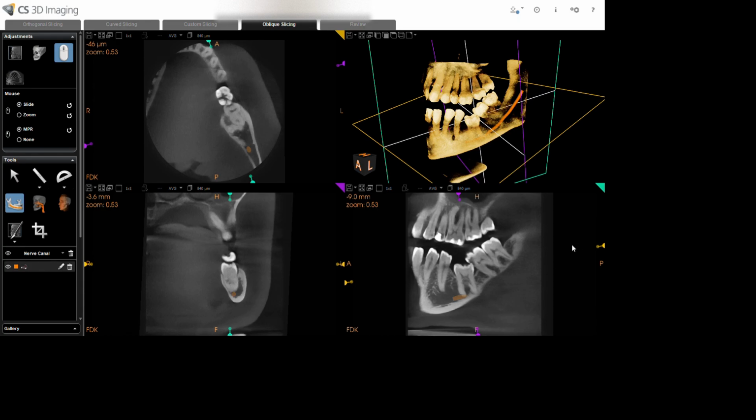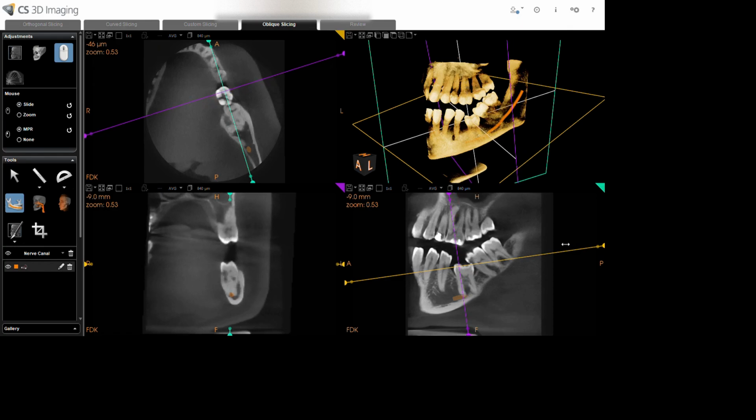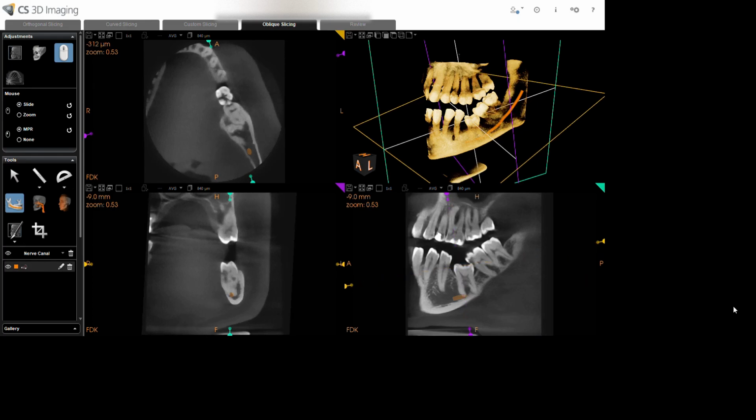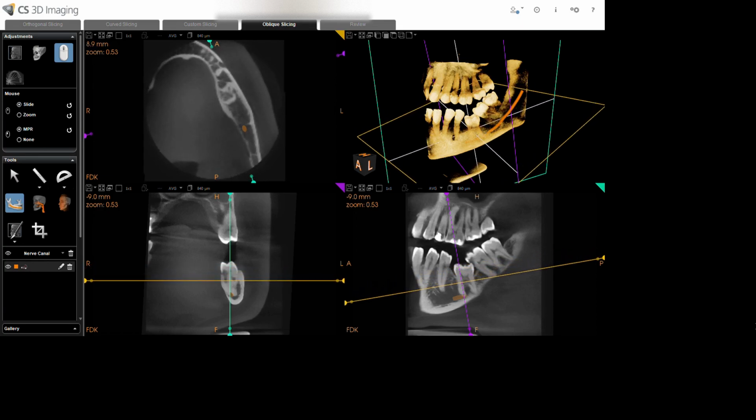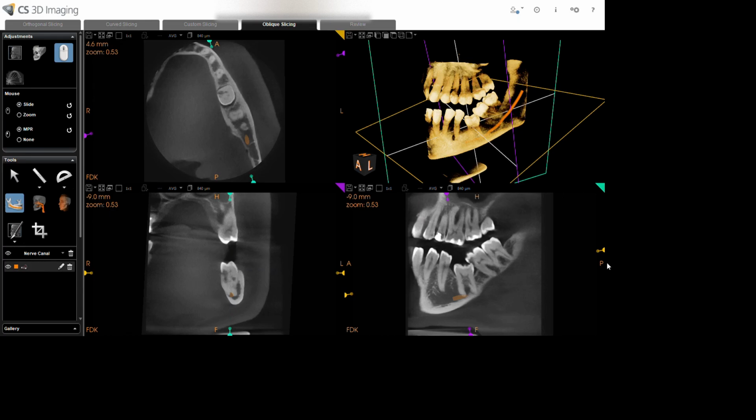The next thing, as you can see, is that the alveolar process is underdeveloped. The crest is not at the same level as compared to the adjacent teeth. Of the adjacent teeth, we see where the crestal level is here, whereas for tooth 36, the crestal level is here. Now, this tooth is not like a normal tooth. First of all, there is a lot of resorption in this tooth.